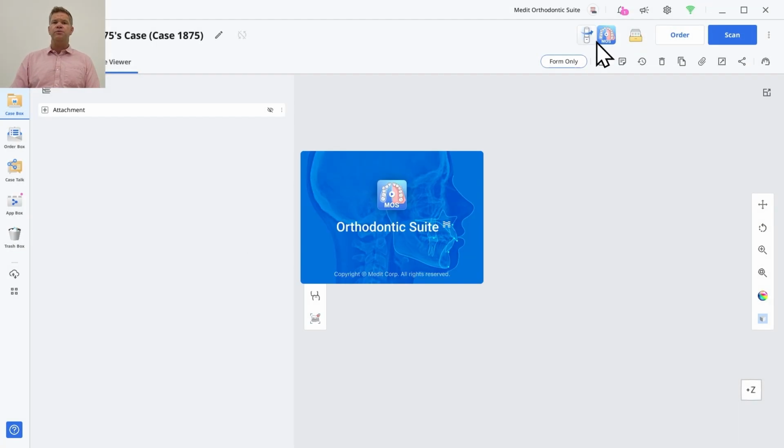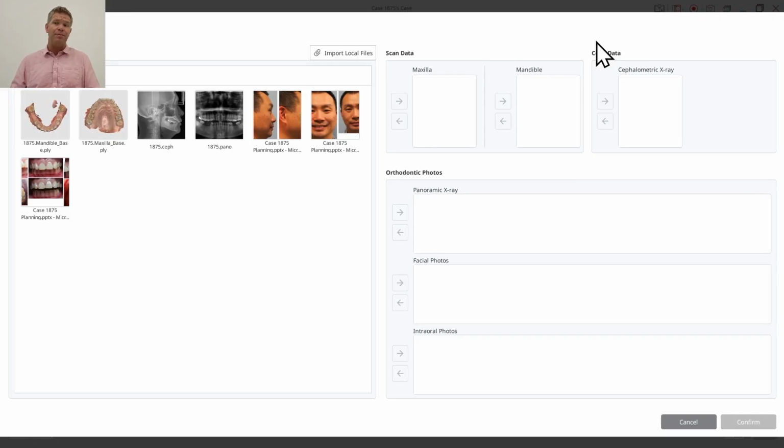All right, now we're going to move on to a different case that will allow us to go through some of the troubleshooting that can arise by commonly known things that happen in your clinic that cause this software to need you to place these points a little differently.